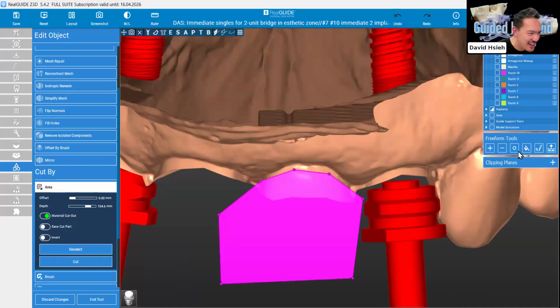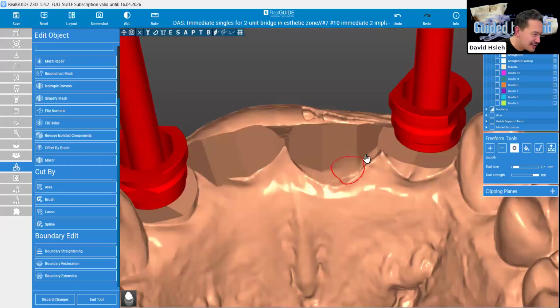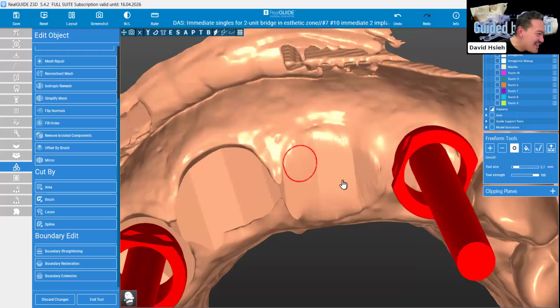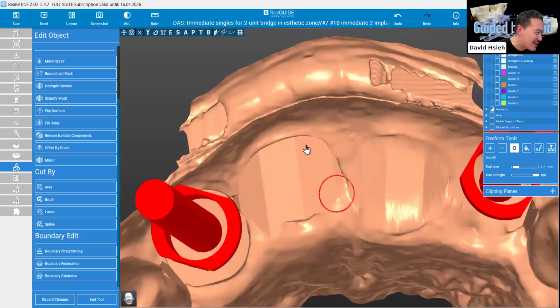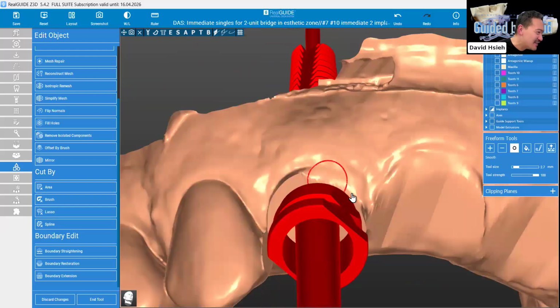That's so cool. And then after the crown has been extracted, there's a smooth tool right here. Basically, just like a wax knife. How cool is that, right? You can basically do anything you want to the model. It's just like a lab party right now. So cool, I love this part.